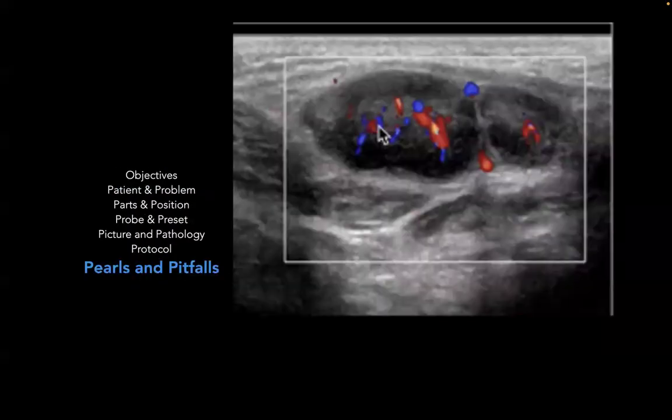So looking at the area and evaluating, let's say, the neck mass, you see something like this. And this is your typical lymph node. An average typical lymph node is oval in shape. It has an echogenic hilum. So this is how it usually looks. Echogenic meaning white, and it's oval in shape, usually less than 1 centimeter, right? And usually the color Doppler will show internal central flow.